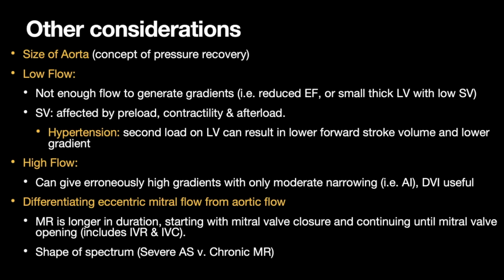Finally, the shape of the spectrum can help you in comparing severe AS with chronic MR, but acute MR can give you a similar profile to severe AS, so be cautious with that. And of course, look at your measurements and see where the cursor is pointing to.